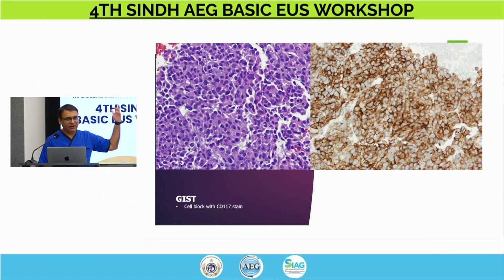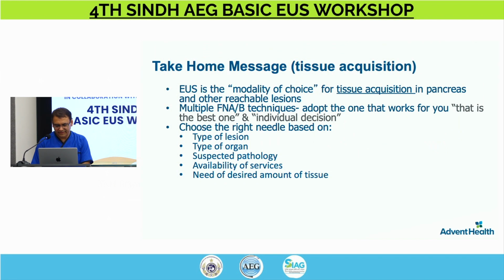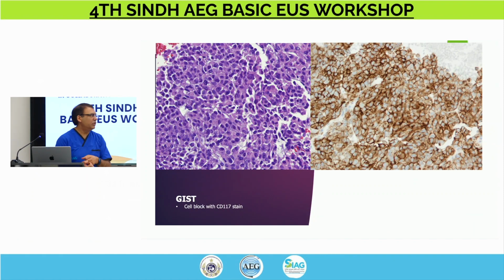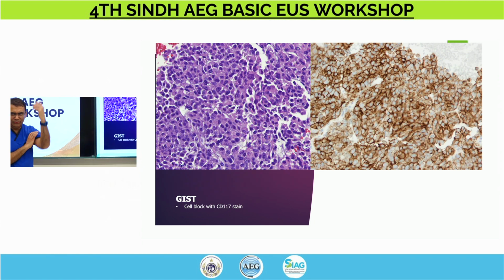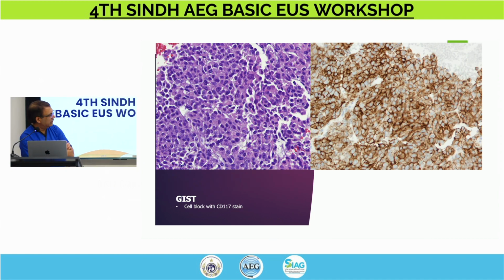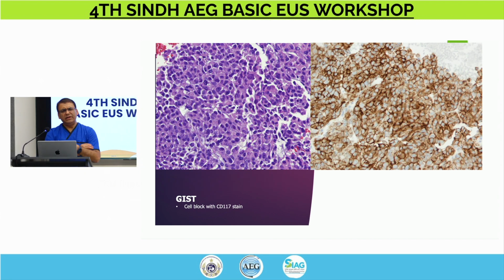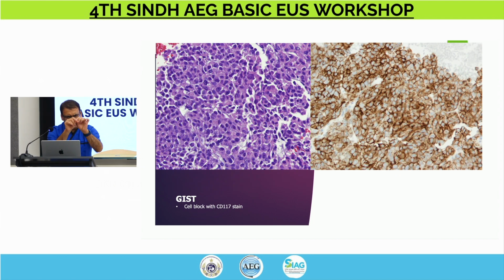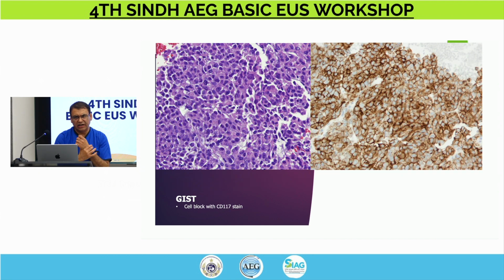I was going to ask what stain you use for GIST, but it's right there. It's more like, what is the difference? Why did you bring that up? Those cells are normally spindle cells. With the 10% we have mixed variation. It looks more like spindle cells, literally like spindle smooth muscle cells. In this one, sometimes there could be more of a cellular component to it.